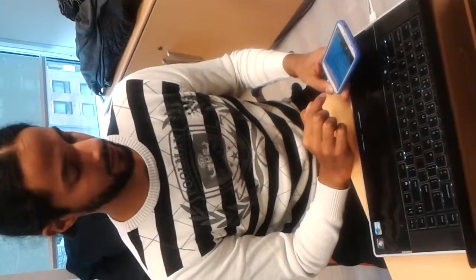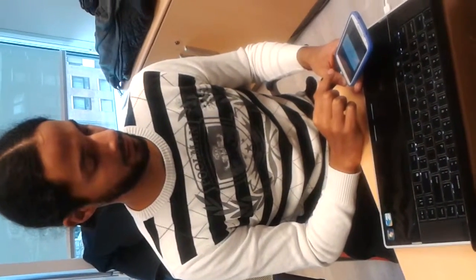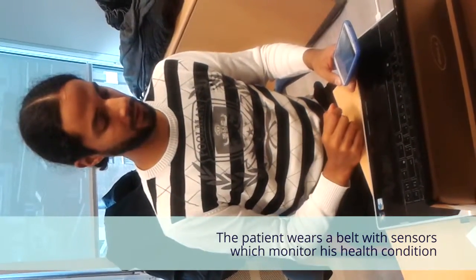Following that, I will get the instructions to start a monitoring session. Okay. So the system is telling me to wear the sensor belt. I have put it on already. So now I will just press start, and the system will begin measuring various physiological parameters.